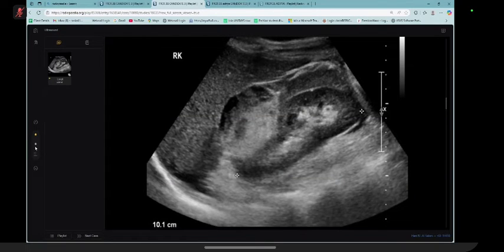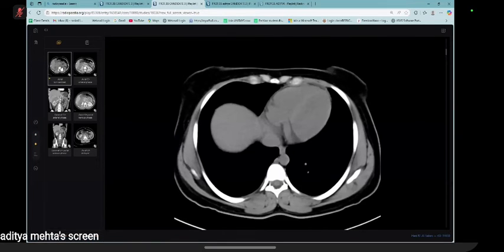I will give you CT scan. I have one. We did it. Have a look at it. Which type of the CT image do you want? Preferably post-contrast. Okay, I'll give you post contrast then.